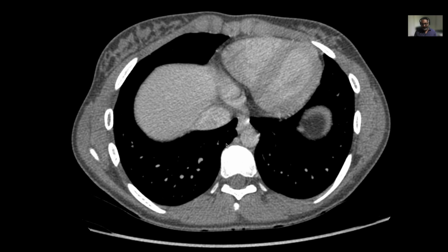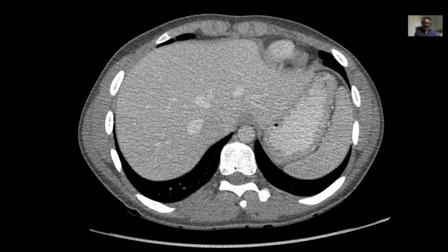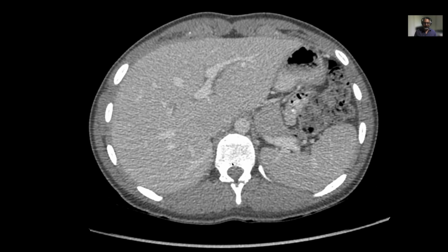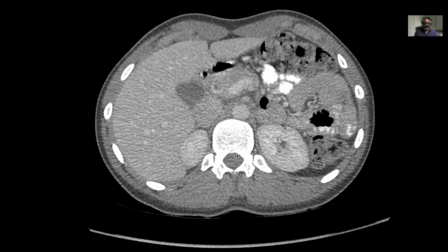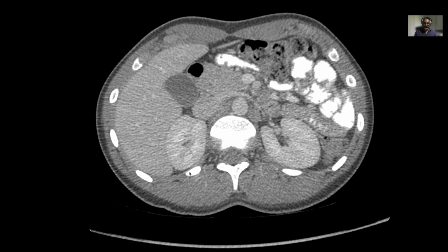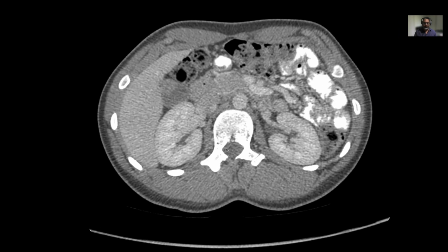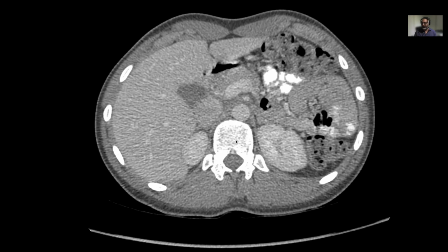Then the next thing I do is find which vertebra this is. You can see there's a rib coming out, so it's still a thoracic vertebra. Let's check out the next vertebra, and there's a rib coming from there also, still a thoracic vertebra. Next vertebra, rib coming from there, still a thoracic vertebra. And then next vertebra, no rib. Oh, that was a rib, sorry. And this vertebra, no rib. So this vertebra is T12. So that's T12.